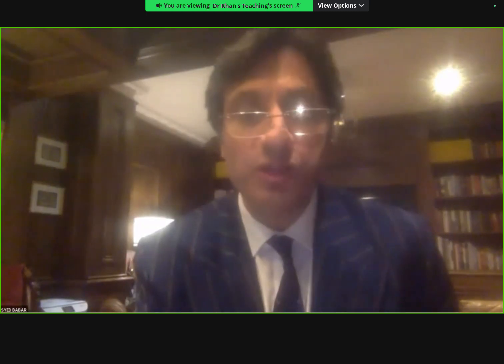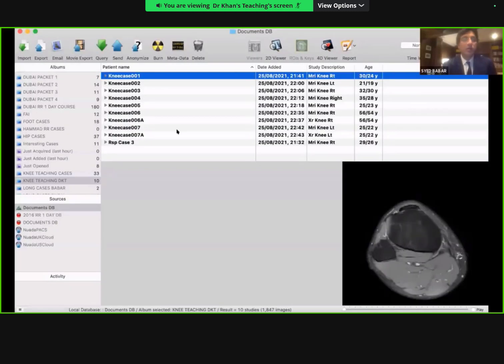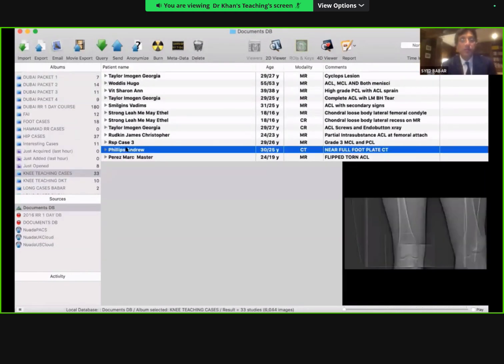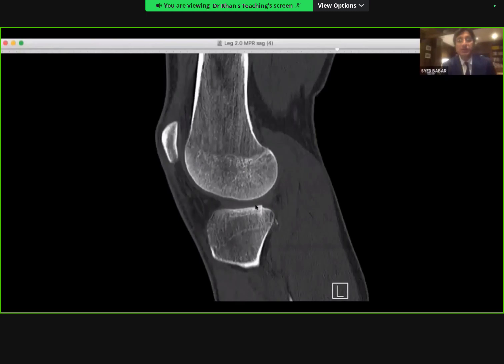I've just stopped sharing because I need to bring up the CT of this patient. Oh, hang on. Share. So, okay, I'm just going to bring this up. I'm going to stop share and then reshare again to see if we can actually see the CT. Okay, this is the CT of the same patient.